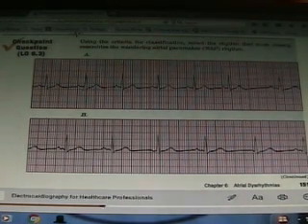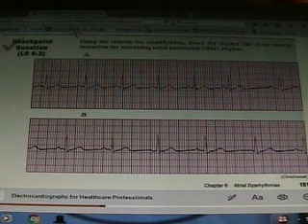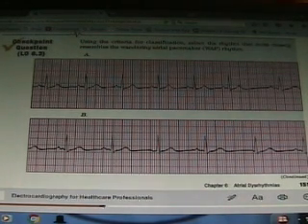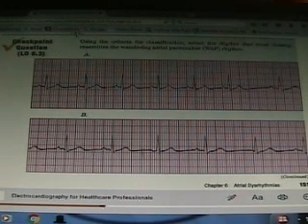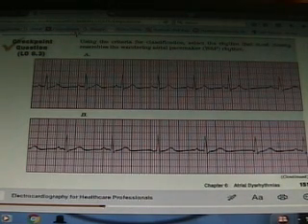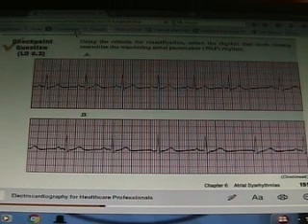Yep. And let's look at this one on the top. Look at the P wave. It's 3 boxes. Oh no, this one's more, but this one's more regular too. Let me look at these. This P wave, but whoa. No P wave. No P wave. And now, it's not 4 boxes, this is now what? 4, almost 5.